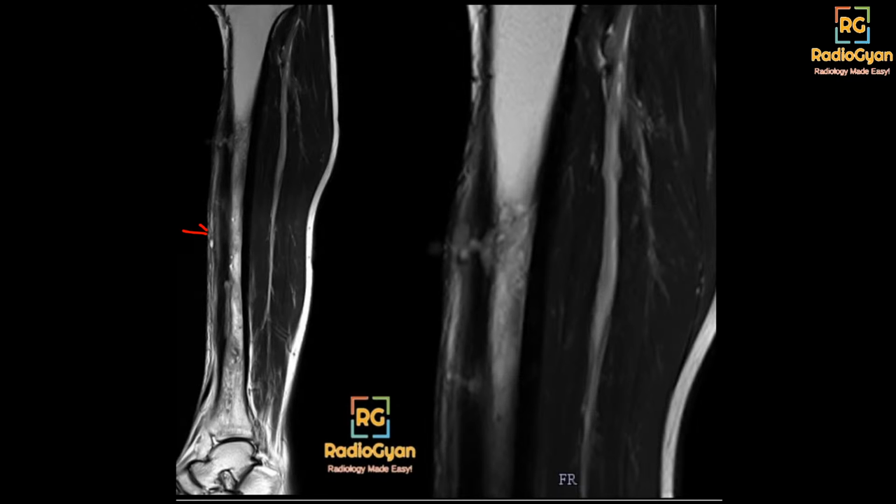So if you look at the posterior periosteum, it's probably normal, but especially if you look here, the cortex here is very thin. So I mean the cortex, not the periosteum. So the cortex is very thin, but if you come on to the diaphysis here, you see that the cortex is abnormally thickened, and there is an area of altered marrow signal intensity, and there is this tract draining up to the skin. So as all of you have pointed out, there are in fact maybe a couple of tracts.